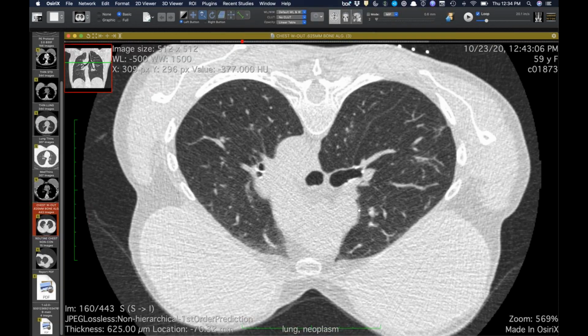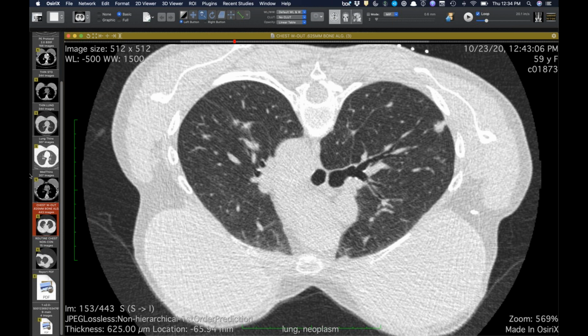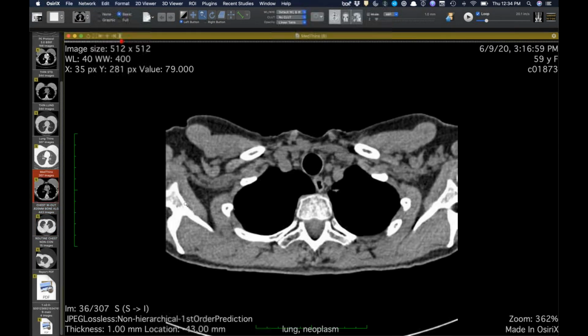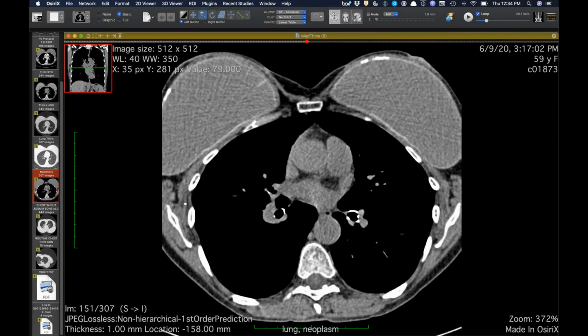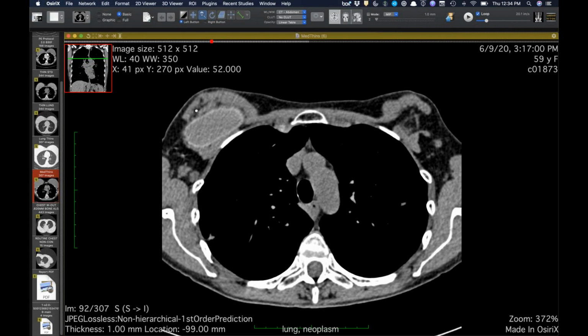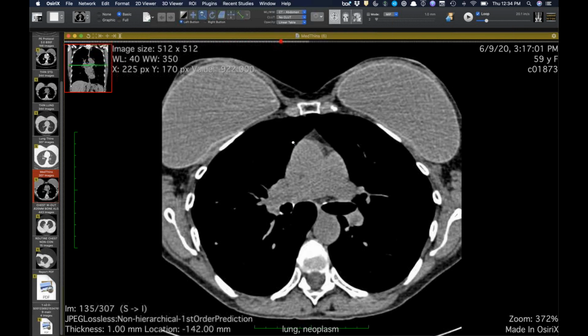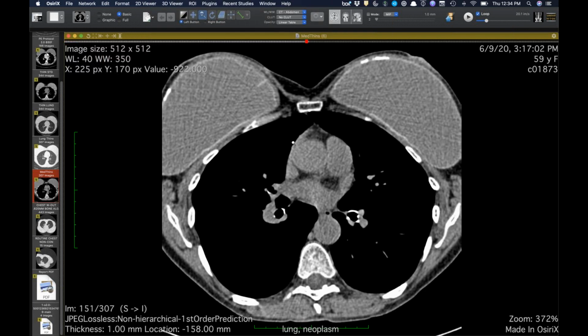The clinician and the patient were both anxious, and so we did a CT guided biopsy of these. Does anybody want to take a guess at what this might be? Any thoughts? I mean, this looks like some sort of granulomatous disease. I would think mostly sarcoid since she's asymptomatic. You thought maybe they were increasing slightly?